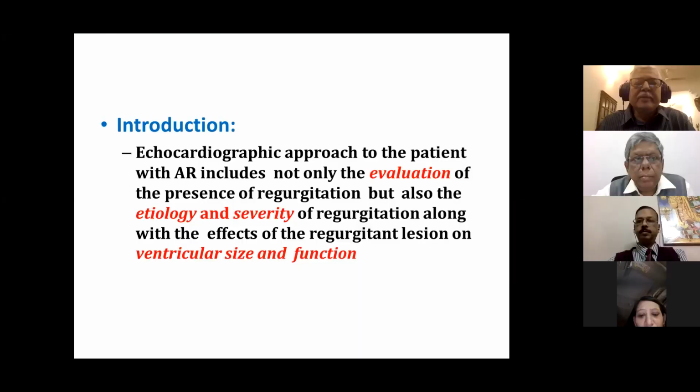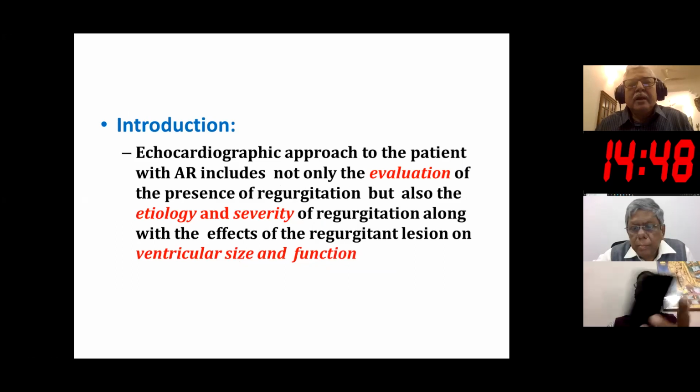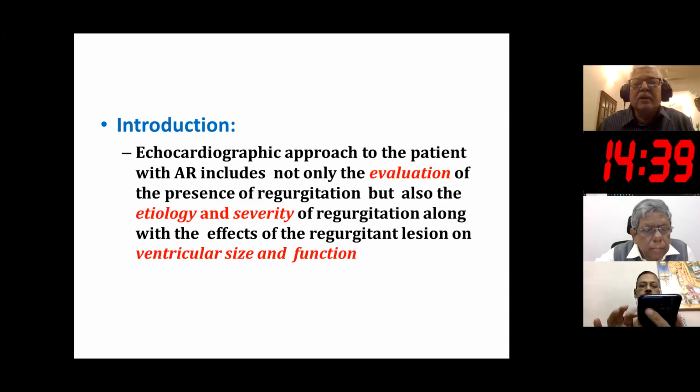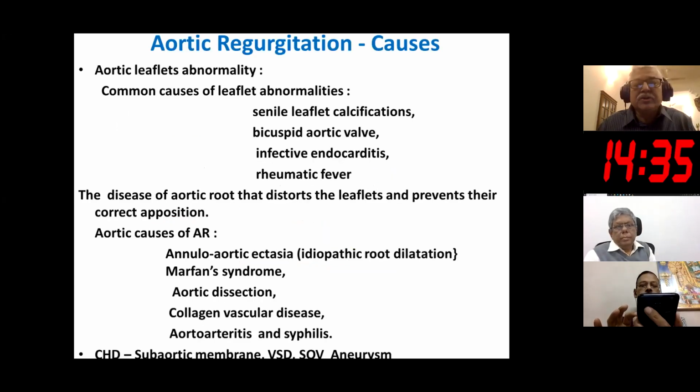So today I will be talking on the approaches to evaluating aortic valve regurgitation. And let me say that the echocardiographic approach is the mainstay. We not only evaluate the etiology and severity, but also the presence of regurgitation, the ventricular size and function.